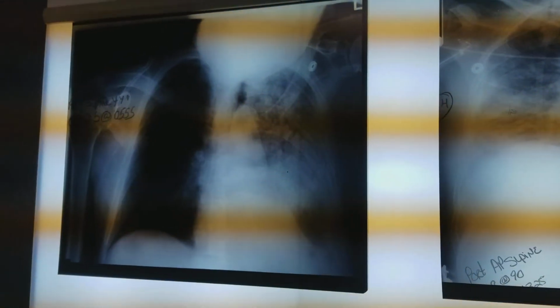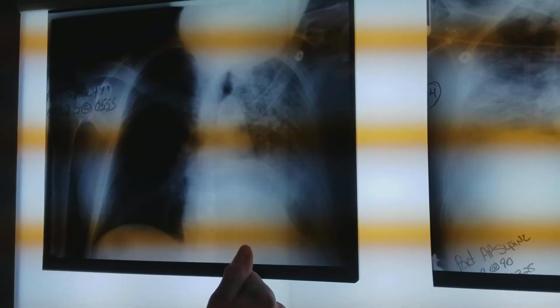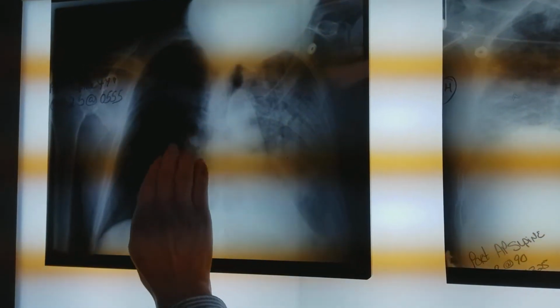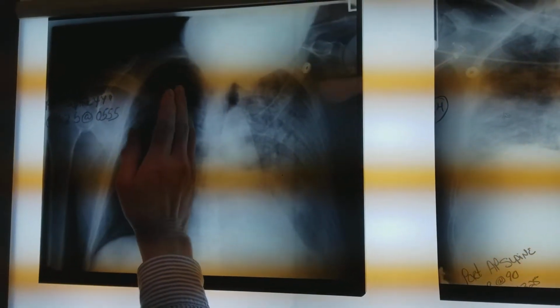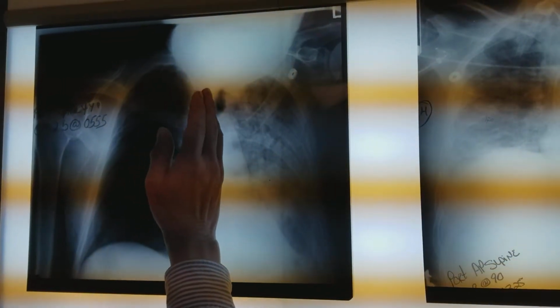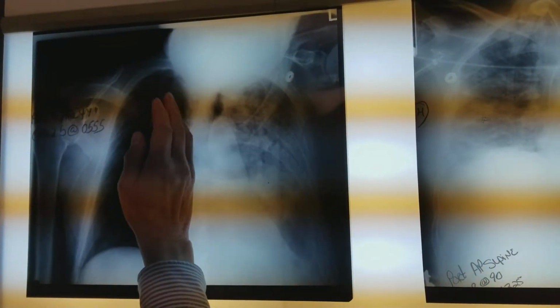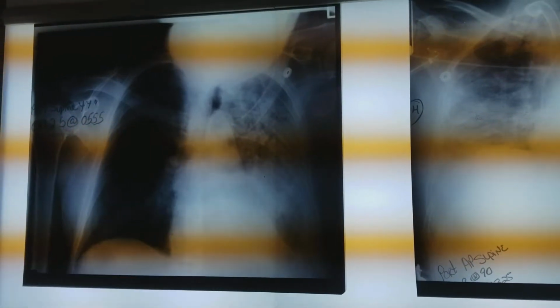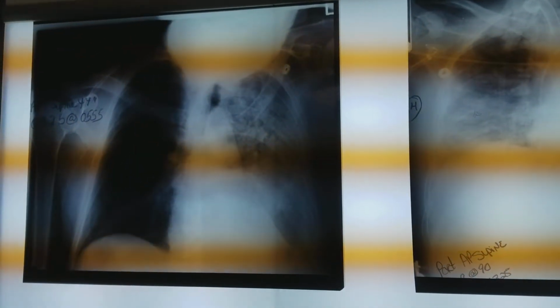Now, what we can also see is that your trachea is shifting towards it. So it's moving towards it. And so what that is, I want you to think about some things, but that's because your patient is contorted. So it can fool you a little bit.